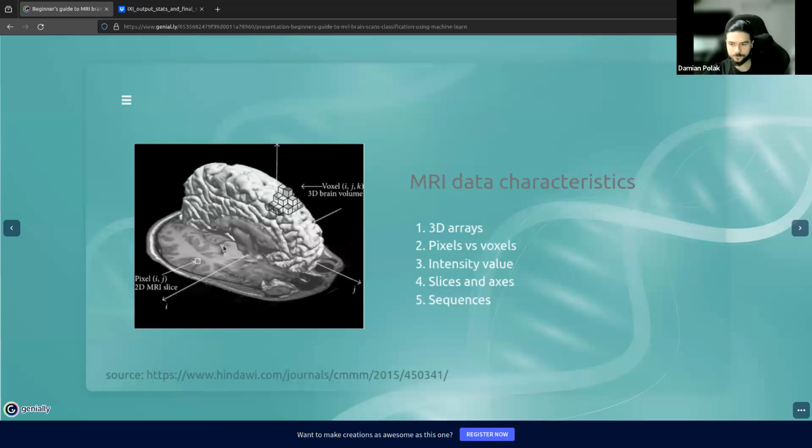in some color space. In MRI data, we only have 1 intensity value for each voxel, similar to grayscale images. Slices are two-dimensional arrays, planes in one of the axes. These slices consist of pixels with intensity values, and I will demonstrate a sample scan in FreeView, a tool that is a part of FastSurfer. FreeView is a GUI tool that allows you to examine scans in each axis.